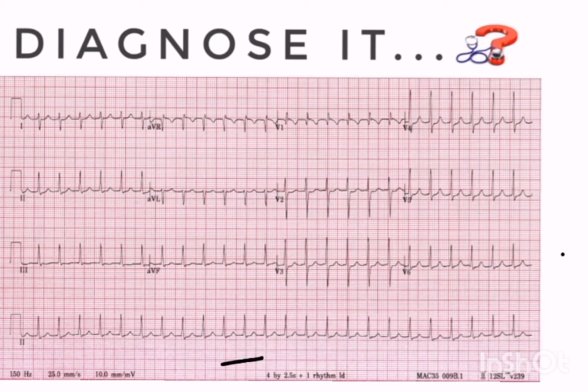As you can see here, the waves are not looking like the flutter and fibrillation kind of waves, so we can rule out those. The next thing that we see is the presence of P wave. As you can see, there is no P wave present. So if P wave is not present, then we can rule out sinus tachycardia and atrial tachycardia, because in these two tachycardias we have a P wave. It may be normal or abnormal morphology, but there is a P wave present. So by this we can say our tachycardia can be junctional tachycardia, AVRT or AVNRT.